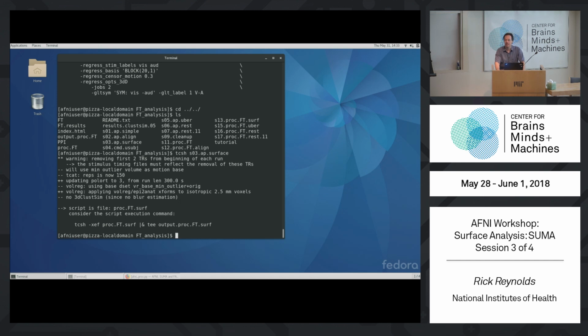Okay, the analysis didn't happen. This is what afni_proc does: it has written a processing script. On Tuesday, we had that -execute option, so it actually started running the analysis for us. With the -execute option, afni_proc basically fires off this command for us.